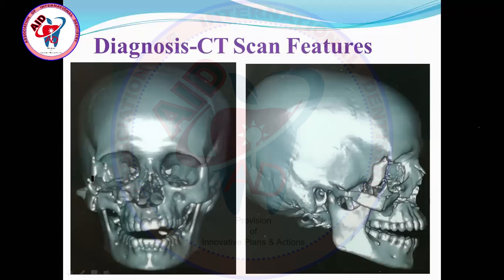Again, there is also another fracture, and all these fractures have led to the outward and lateral displacement of the whole zygomatic bone, as well as the lateral orbital wall and floor of orbit, which has increased the orbital volume. If you see the contours of the contralateral normal orbit, it is normal. The zygomatic bone is also in its normal place, but here on the right side, the bone has been displaced. The overall volume of the orbit has increased.